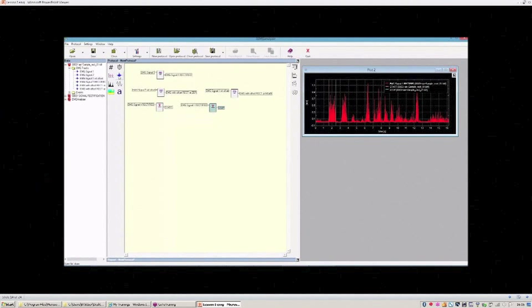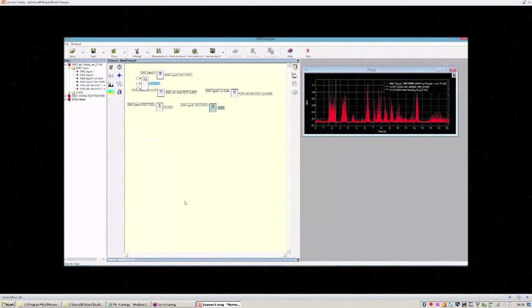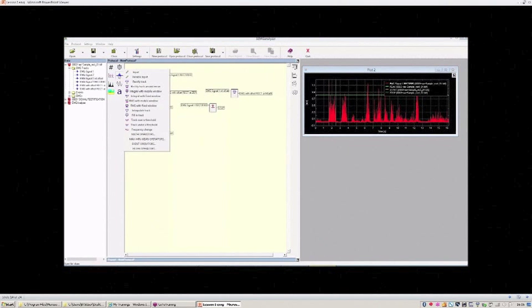we can, for example, compute the average value of the rectified EMG between these two events. So we can choose, or the maximum, sorry. We can choose to compute the maximum first. So the first input is going to be the rectified signal, the second the start event, and the third the stop event. And so this is the result. As you can see, we have computed now the peak value of the rectified EMG into the time interval.